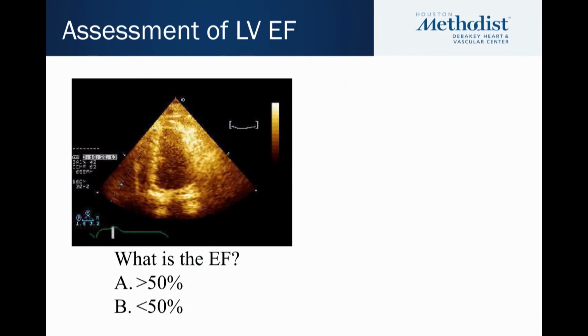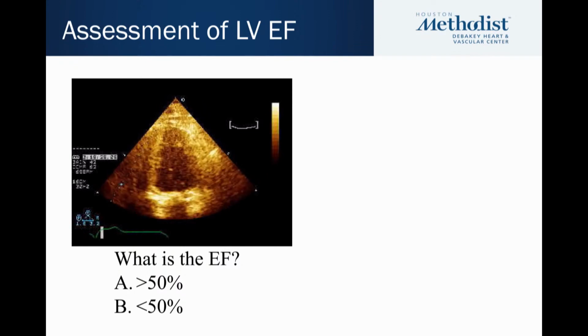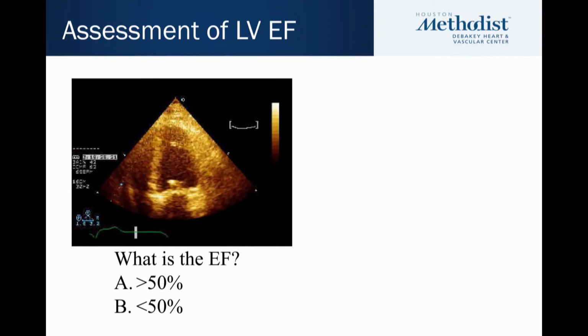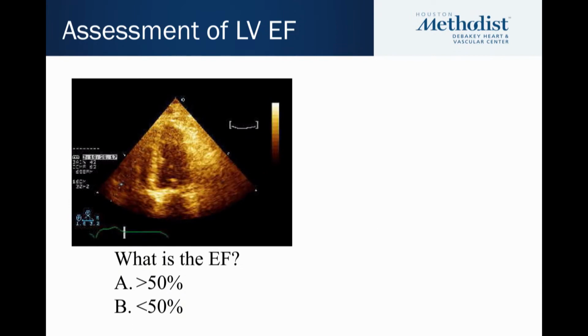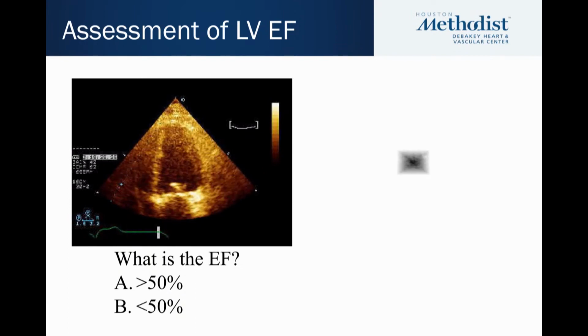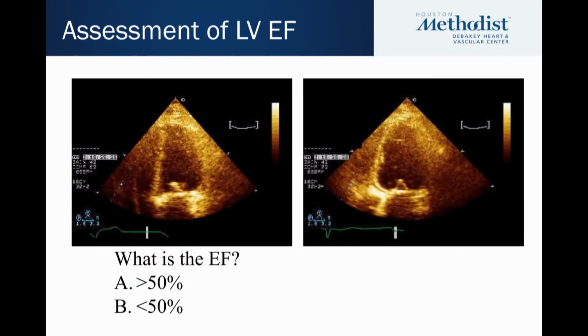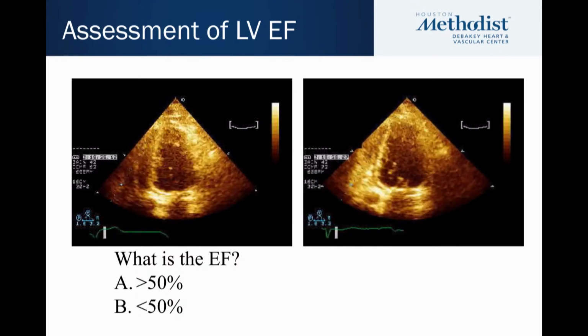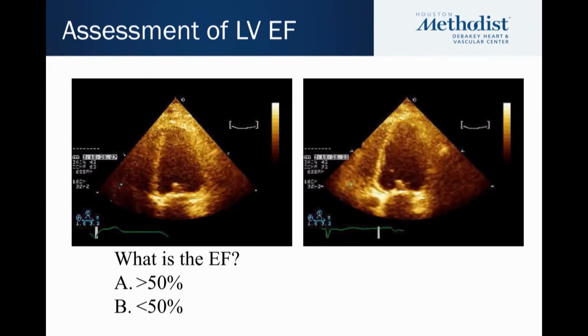What do you think is the ejection fraction? Would you say it is better than 50% or less than 50%? To be honest, if I were to look at this, I would say it probably looks like it's better than 50%. Well, look at this picture now. What do you think? Is that a good EF? Certainly not. It's the same patient, done seconds apart.